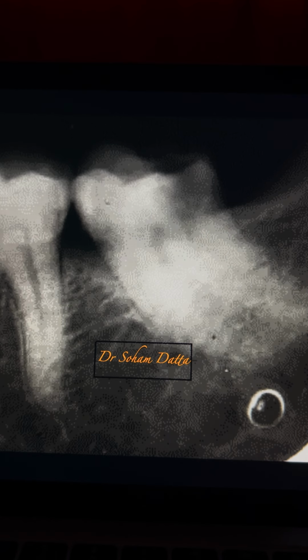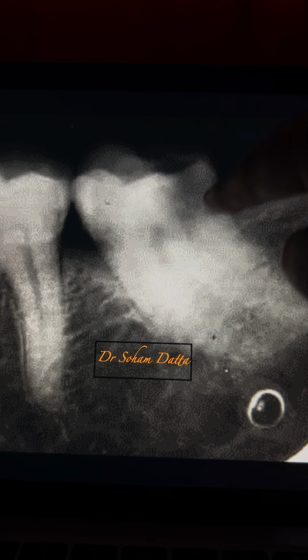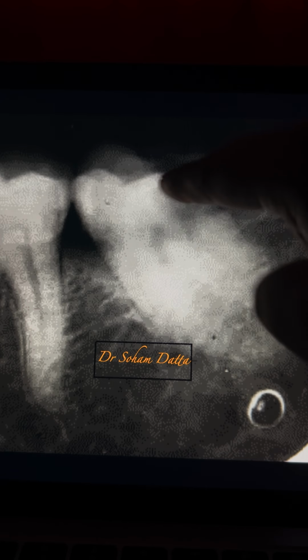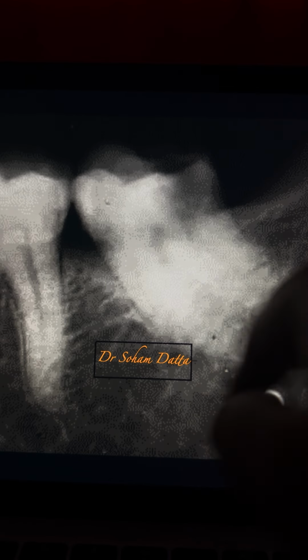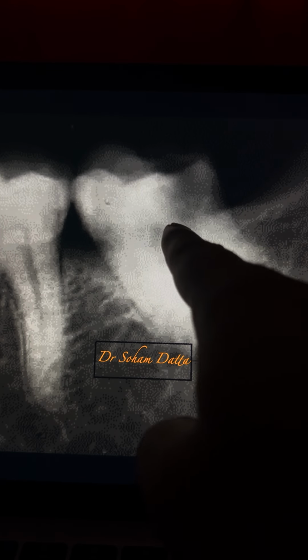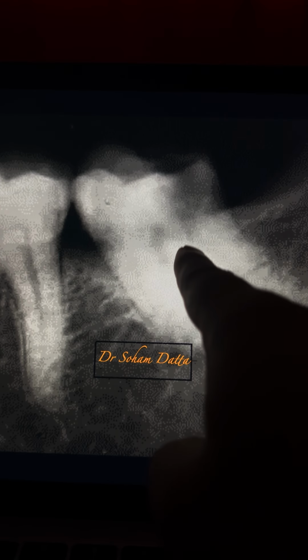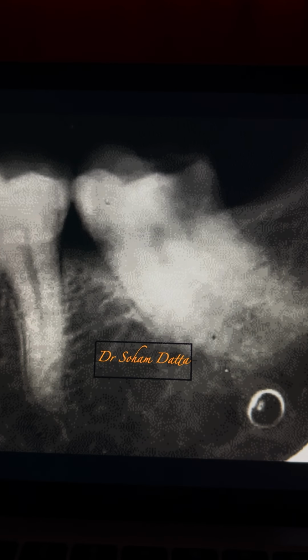Now if we analyze the X-ray, yes, there is a distal caries present in the 8 on the distal surface. You can see a slightly visible pulp chamber space, and the root canal space is not clearly visible from this pre-operative X-ray. Yes, some amount of distal canal shadow is there, a little bit, but not fully clear.